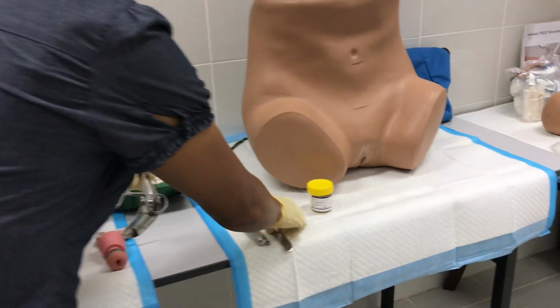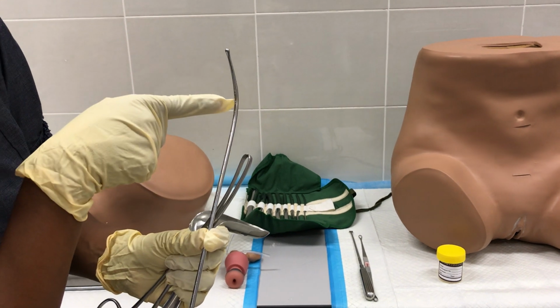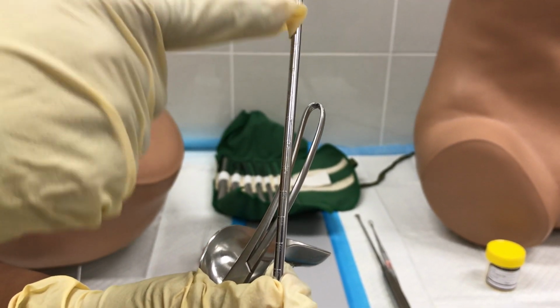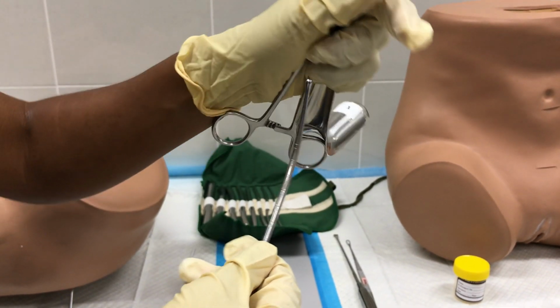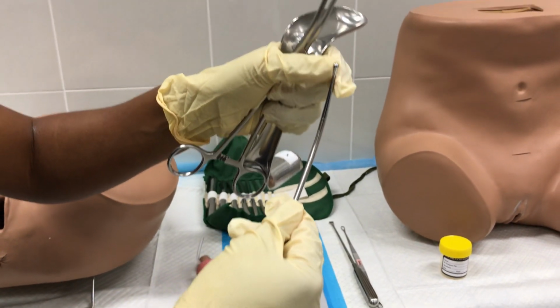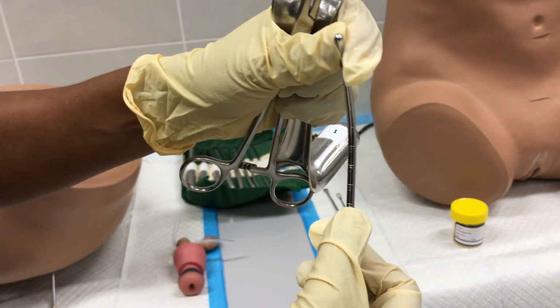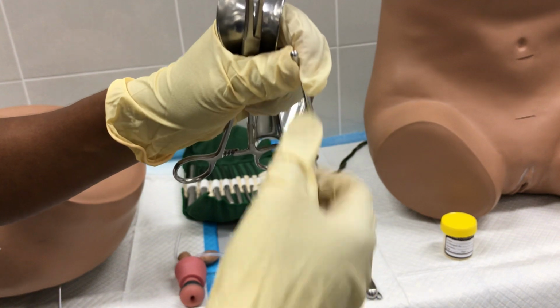And then this one is the uterine sound, where you can see the length of the uterus in centimeters: 8, 9, 10, 11. The tip has to touch the uterine fundus, where there will be a resistant area. According to the uterus length, you can estimate the size: 8 cm, 8-week size, 10-week size, 12-week gravid uterus size.